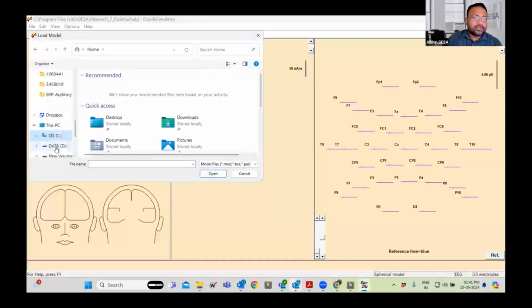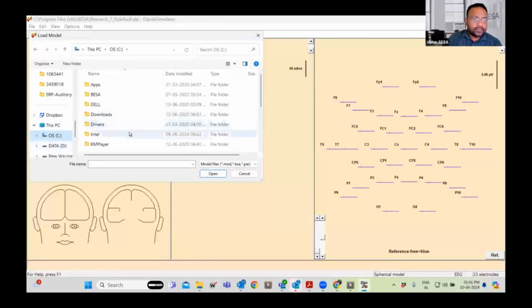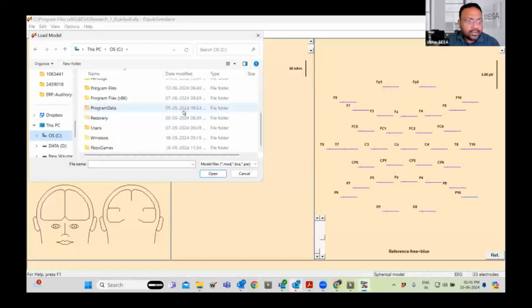Go to C drive. And there I go to program files.